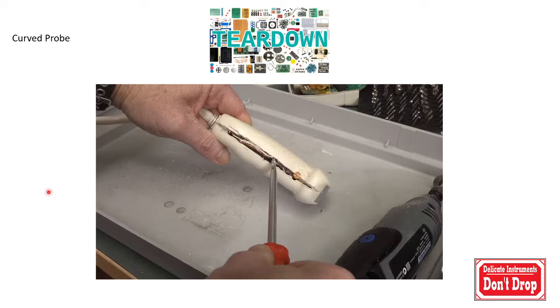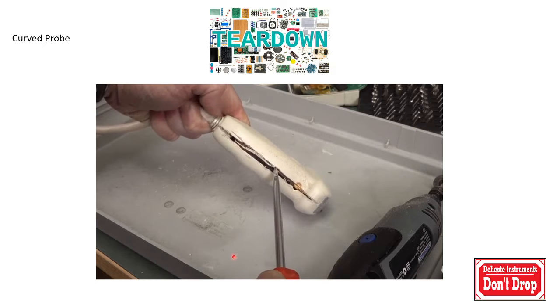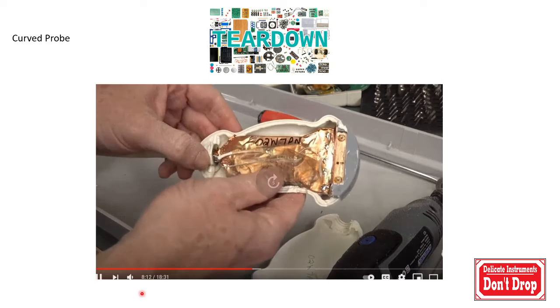inside an echo transducer probe. This is not a cardiac transducer probe. This is a curved probe which we use for abdominal examinations, but they are fairly all the same. In this video, this is a tear down video of an ultrasound probe.